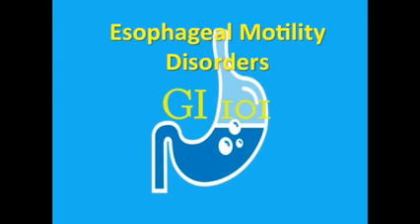Well, I would like to discuss the diagnosis and classification of esophageal motility disorders. In particular, I would like to show how we use the technique of high-resolution esophageal manometry to make these diagnoses.